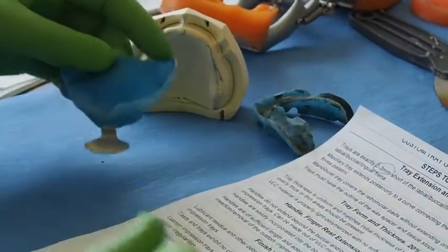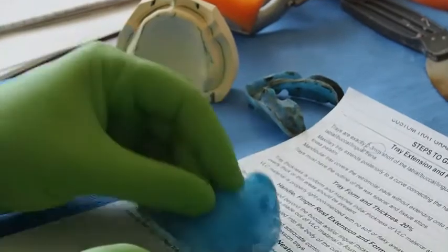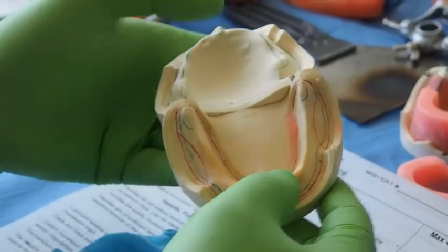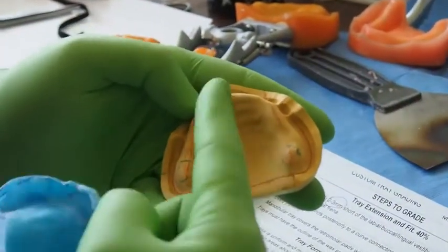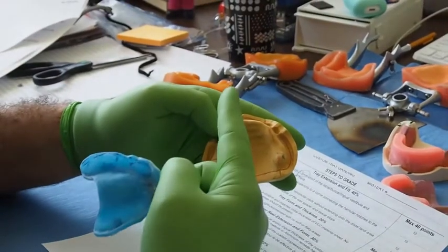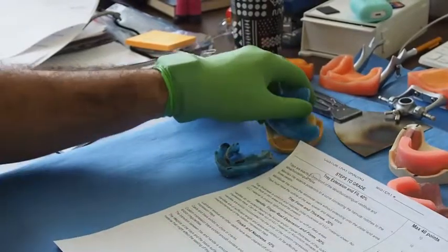Of course, the cast you're using is the one you did the anatomical drawings on. You are not using the cast we provide for base plates and wax rims. You're going to use the older cast, the ones you did the anatomy project on. Those are the models you're using for custom impression trays at this point.